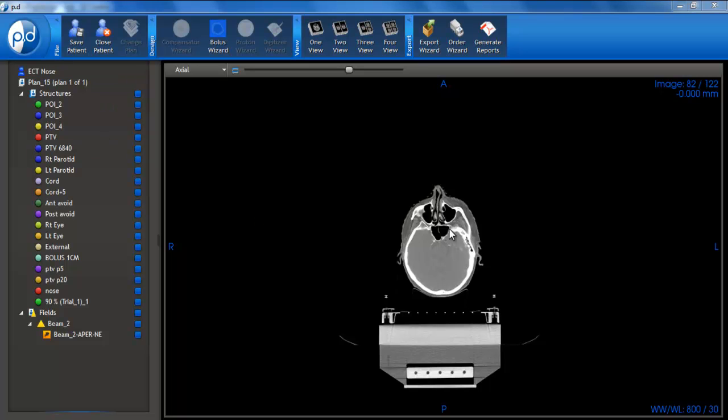If you have any questions regarding loading your patient, importing them, please see our other tutorial videos regarding those subjects. Also note that this video will utilize the Decimal example machine, which is set up in our machine setup tutorial videos. So please see those videos if you are unfamiliar with that or have yet to set up a machine in PD.